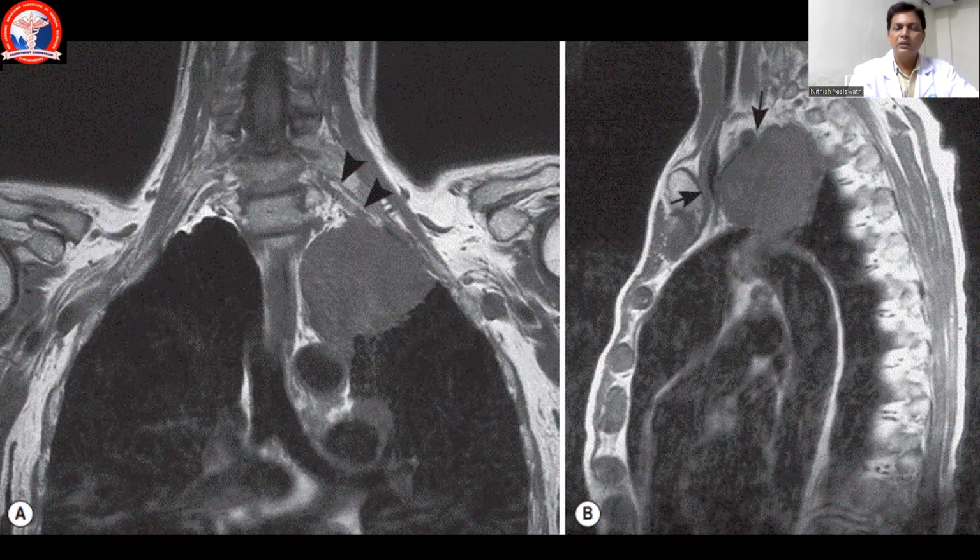So it is a lung tumor, but invading adjacent soft tissue, pleura, ribs, vessels, as well as the brachial plexus. MRI helps in seeing nerve roots very, very well. On radiograph or on CT scan images, we don't get to see the brachial plexus so well. So MRI is very helpful in understanding the status of the disease.